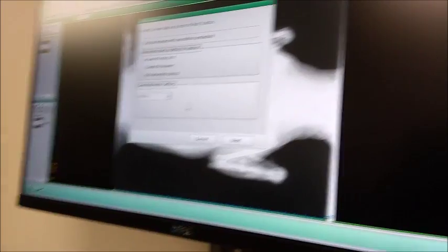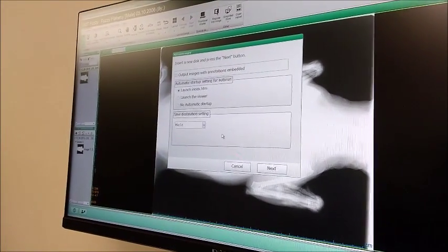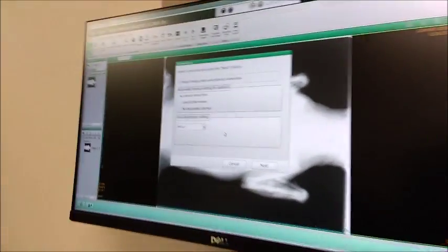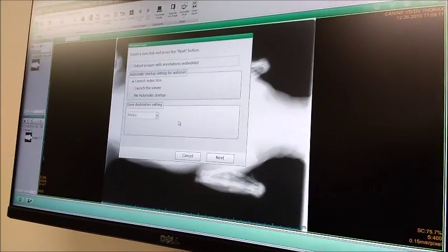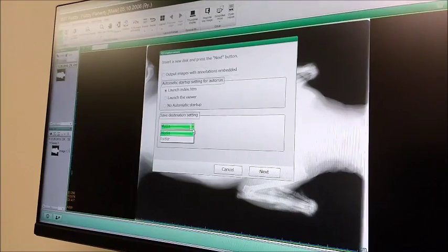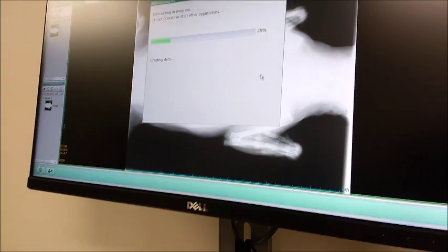Now listen, if you want to put a better view than that, do you do all your little corrections and get a better resolution before you would load it, or does it not matter? You would have your image completely adjusted the way you like to look at it. Correct, yeah. And we're just going through the motions too. Leave that at media. And now it's ready.